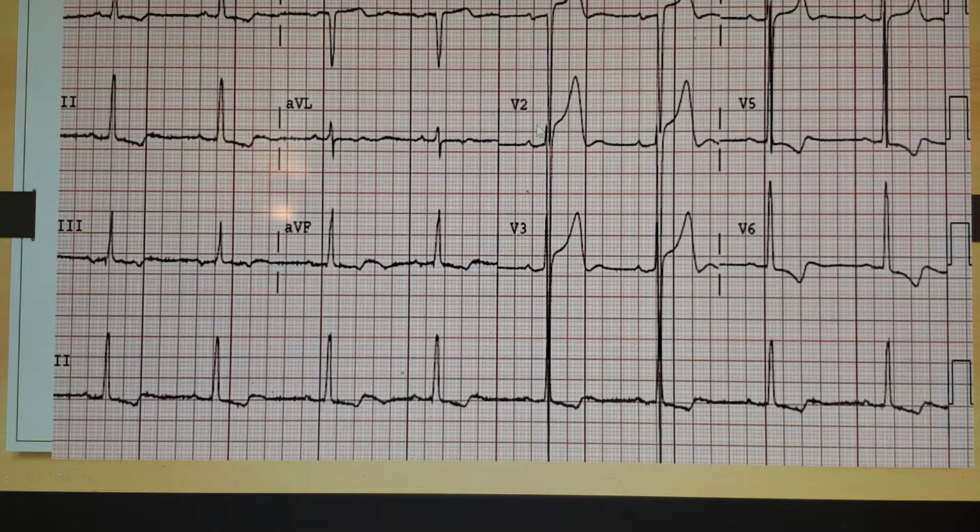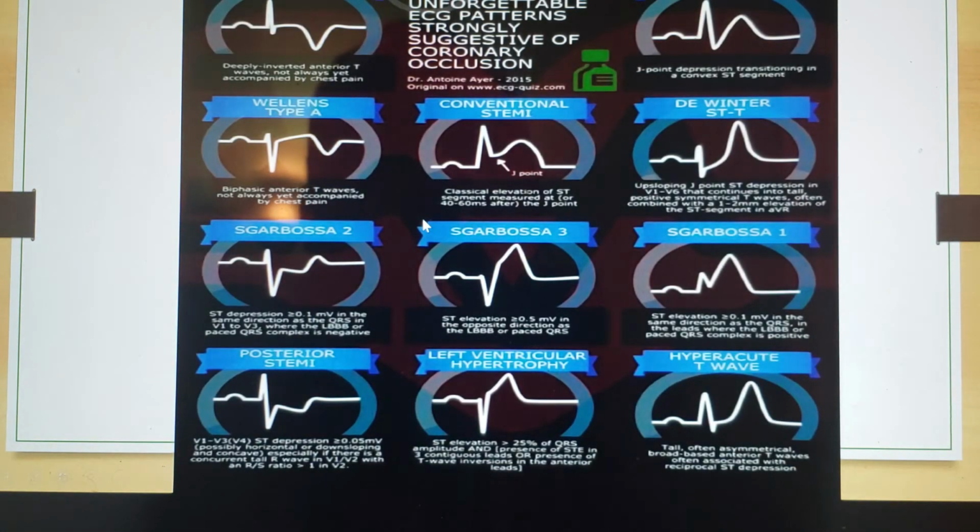It's another one where the strain pattern is really high. Look at that V2 and V3. These are some of the ones that if I see this in a patient, these are maybe ones that I'm faxing to a cardiologist to help me determine what the etiology is. So these can be really difficult. This is one that you may want to take some time to look at.